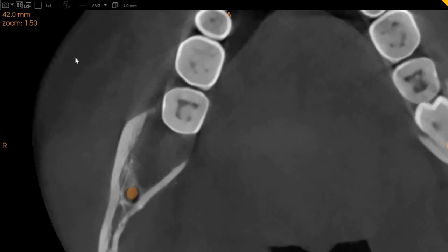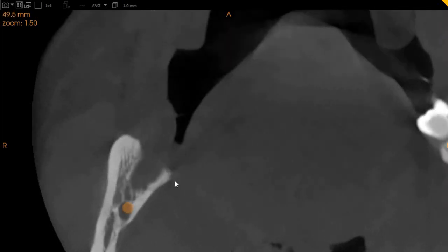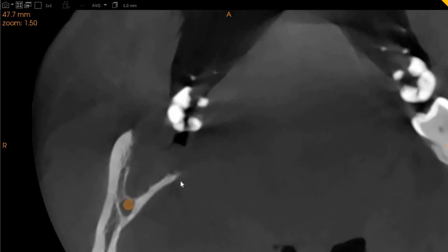This is where we mentioned previously, in the other section, that there's a radio opaque section. This is where we can see it, but it is very slight to cause any problems or discomfort to the patient. This is where the lingual cortical plate fracture can be seen right here, and then this extends slightly downwards as well.